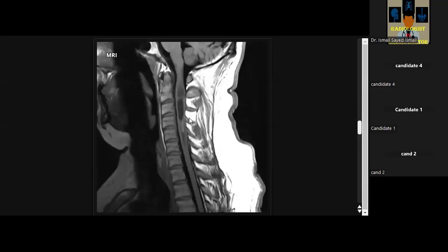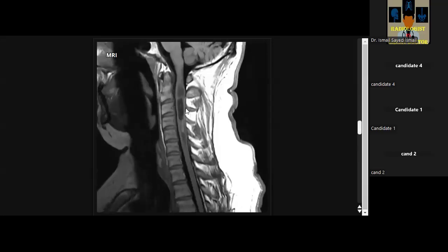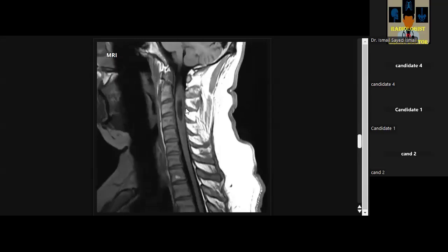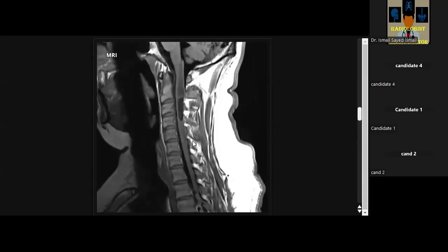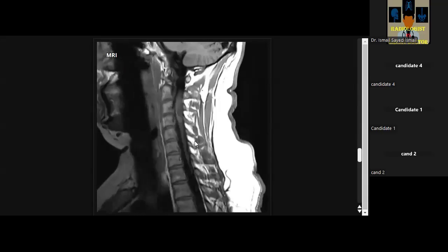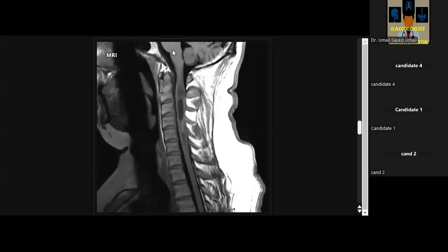This lesion is mostly hypointense on T1, and it appears ovoid or oval in shape. There are adjacent hypointense areas, both superior and inferior to it, suggestive of edema. There is no other lesion noted in the remaining aspects of the spine or spinal cord. The demonstrated posterior fossa, that's the cerebellum, as well as the medulla and the inferior pons, are normal.